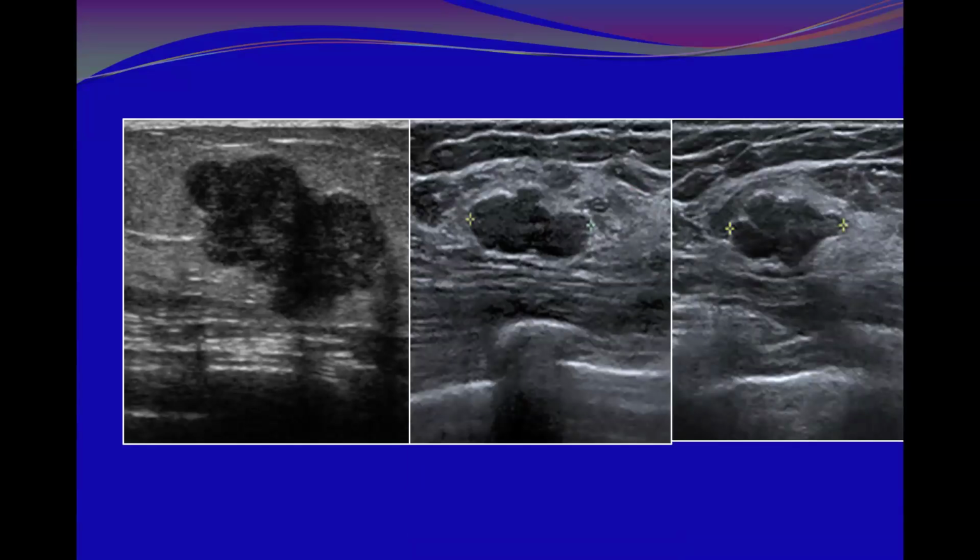When I compare it with these lesions, this is parallel. It is slightly or gently hypoechoic toward isoechoic, while this is deeply hypoechoic with some heterogeneity. Here, more hypoechoic than this area. It is heterogeneous, while this is homogeneous.